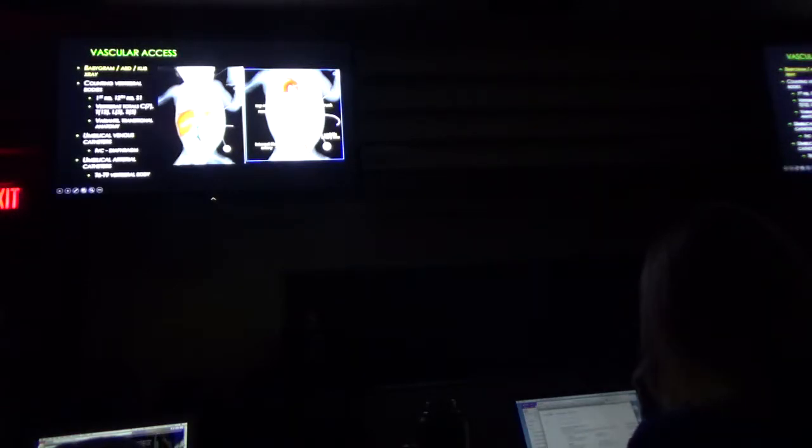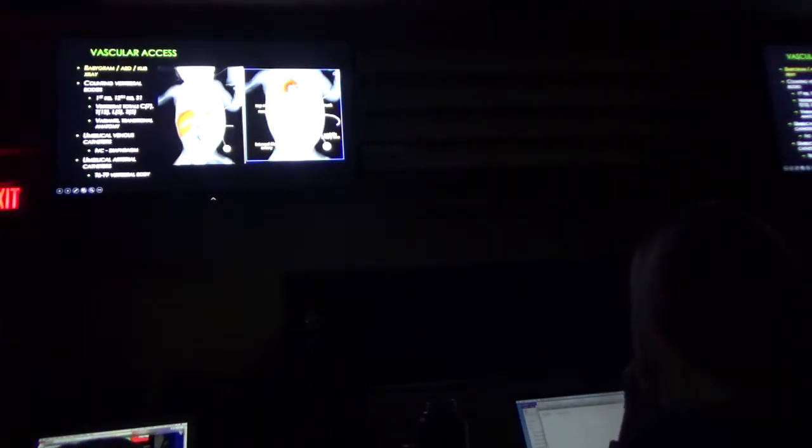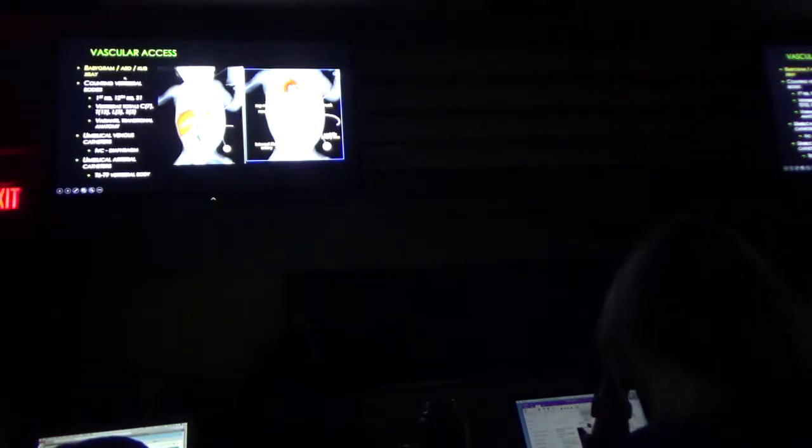Did you do what's called a babygram? That's what this is called. A one-view babygram. Essentially it's all the chest, abdomen, pretty much everything, all in one view. So there it is, babygram: it's abdomen, KUB, chest x-ray, all of it together.